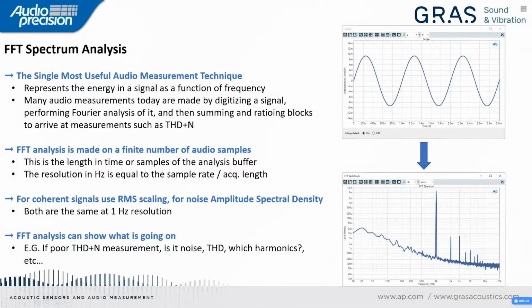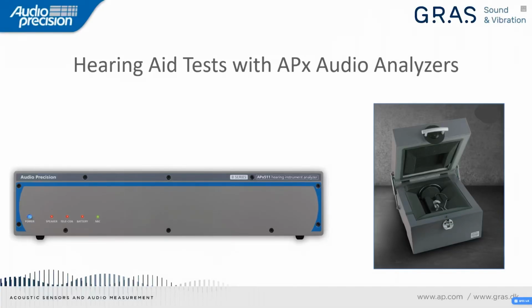Today, Joe Bergin will be leading the conversation around headphone audio test, hearing aid audio test. And we'll be providing demonstrations in APX 500 software.